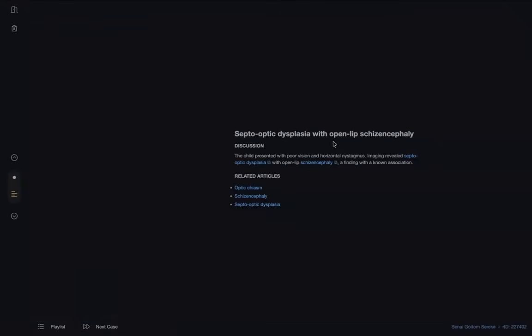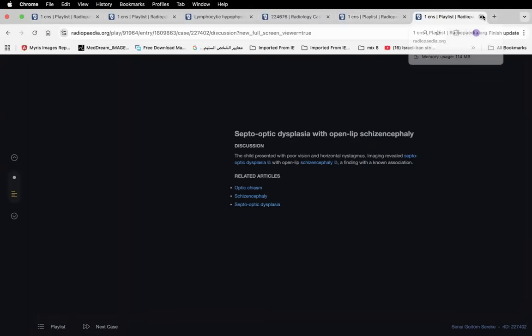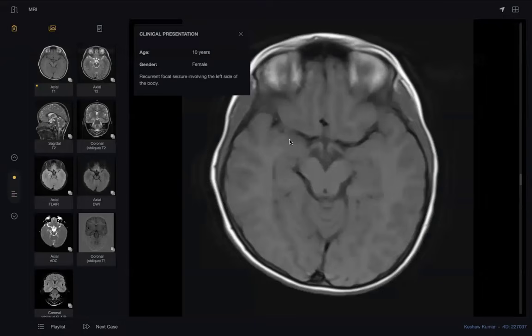I think this case may be presented in long, maybe in short, because it has two findings, you can finish it within 2 to 3 minutes. Very nice, very important. We have closed-lip schizencephaly and we have open-lip schizencephaly. Thank you so much. Next candidate.